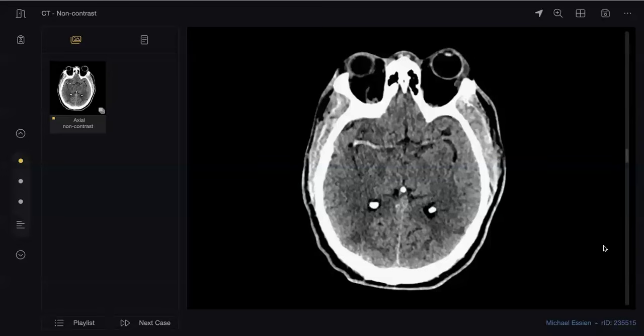This could be middle cerebral artery thrombosis with acute infarction in the right middle cerebral artery territory. This is an emergency. I would refer this patient to the stroke team for management, and also I would proceed with MRI for better evaluation of the extension of the infarction.